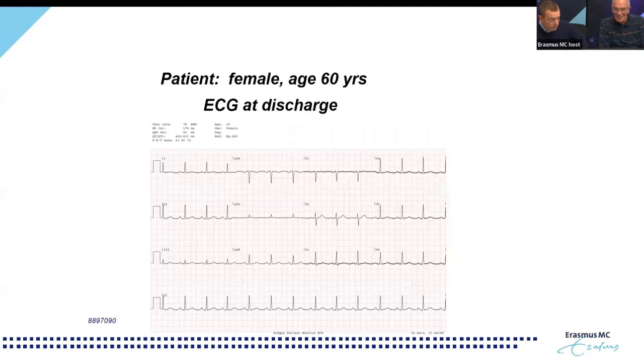So I think one of the key take-home messages is to learn to appreciate the healthy lumen, and learn to appreciate how a hematoma looks. Irrespective of all the cases we showed you, the appearance of the hematoma is rather typical: a well-described cap on the vessel wall, typically nicely and solidly delineated, so it typically doesn't have a very irregular aspect. And it might make sense to look for dissections which could, as Jurgen nicely mentioned, fill the hematoma.